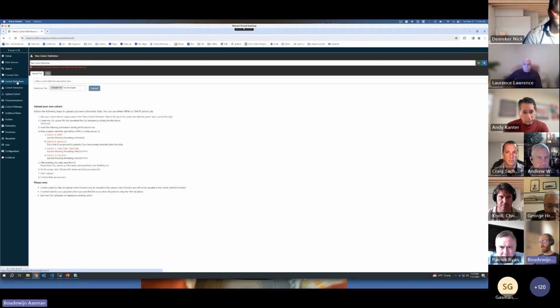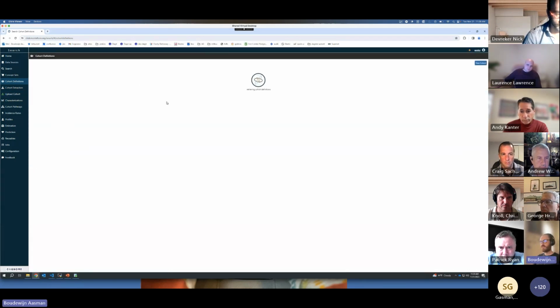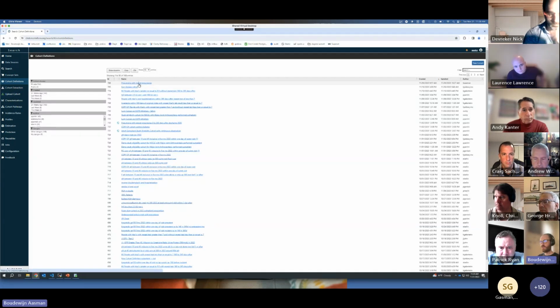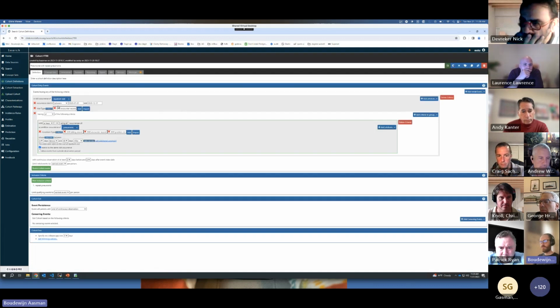I'm gonna look at a cohort I've created, this cohort right here: pneumonia with repeat pneumonia for inpatient visits, people that have had pneumonia and then a repeat condition of pneumonia within a year.